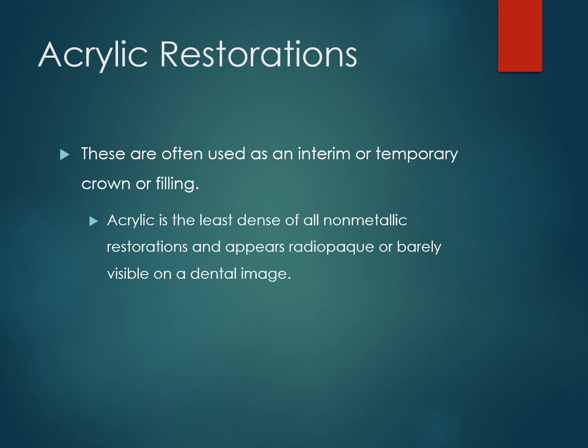That acrylic material actually helps to protect the tooth from being sensitive and from the teeth shifting around it, because if we didn't have that temporary crown on there, the other teeth might shift into that place. And then when the new crown comes in from the lab, the tooth no longer fits because the other teeth shifted.